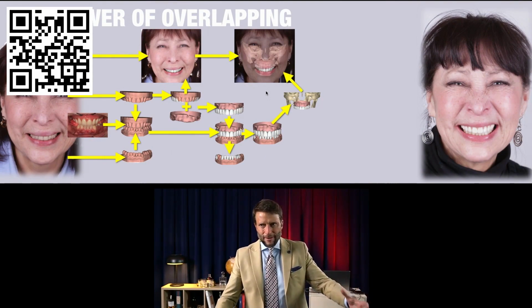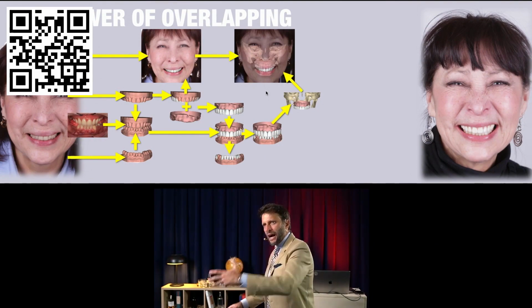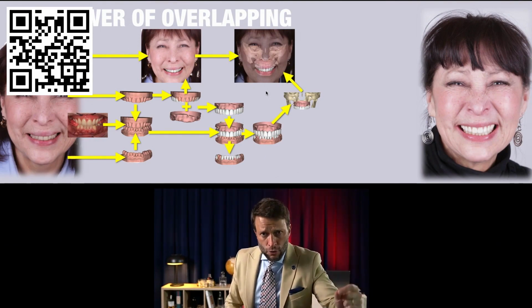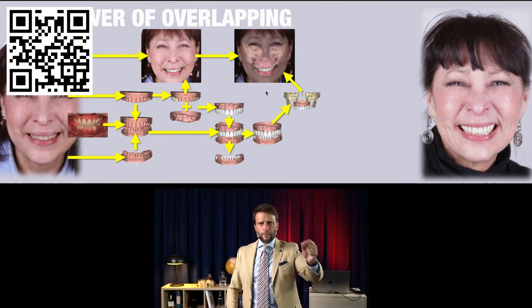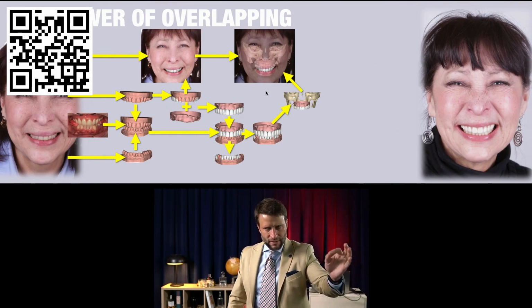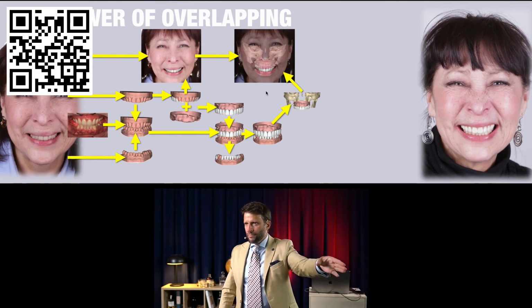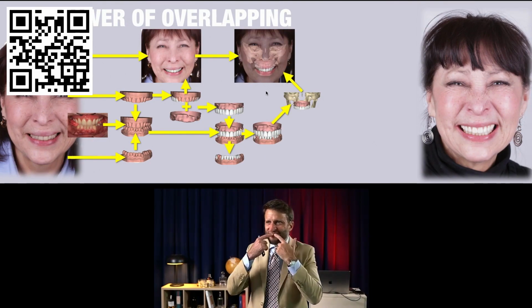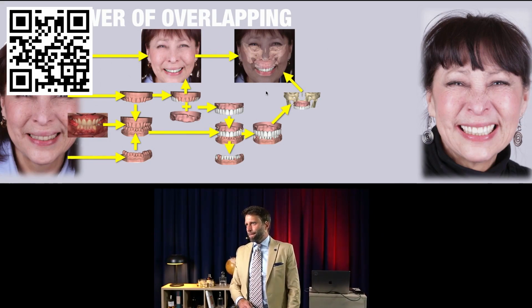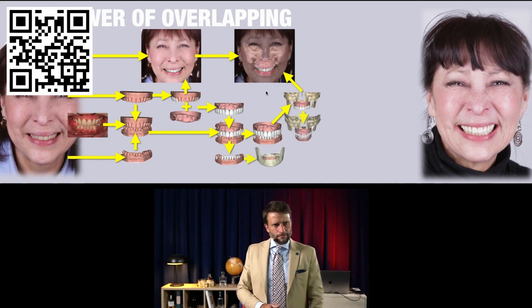It looks obvious, but still today, the huge majority of implant digital planning are not done taking advantage of this. I'm going to repeat. The huge majority of implant digital planning is not done taking advantage of this obvious and easy concept that I'm showing to you right here, right now. People are putting teeth in the mouth according to whatever and then planning the implants towards them. It makes no sense. So we continue.